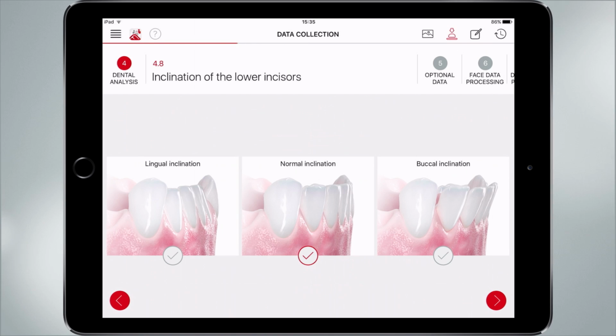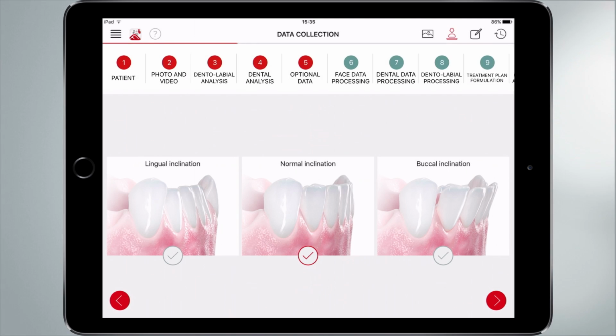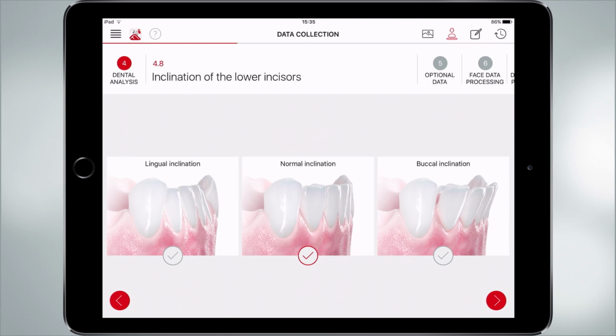So it's data collection, and we have followed all this red circle right now. This part, especially the first part of this area, can be covered by a dental assistant, by another colleague, not a problem. At this point, we have finalized all these steps. So all the data collection is in.